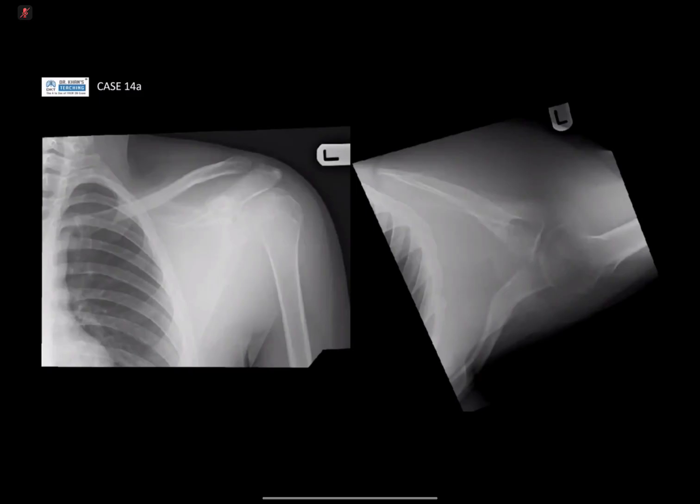Given the frontal and another projection of the left shoulder joint, I can see in the distal end of clavicle and humeral head... It's probably the axillary projection.